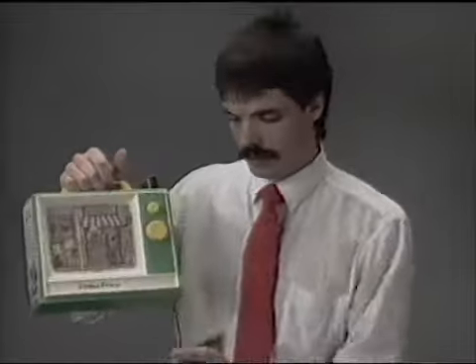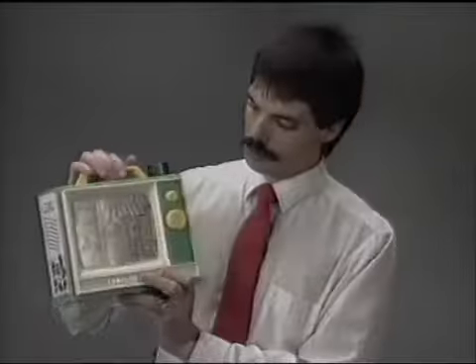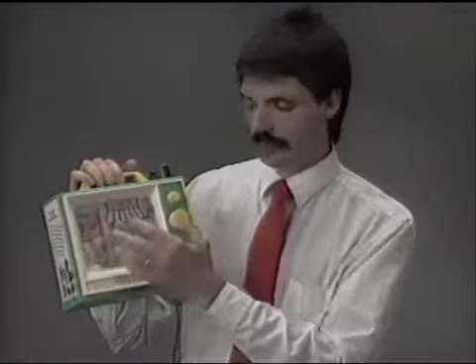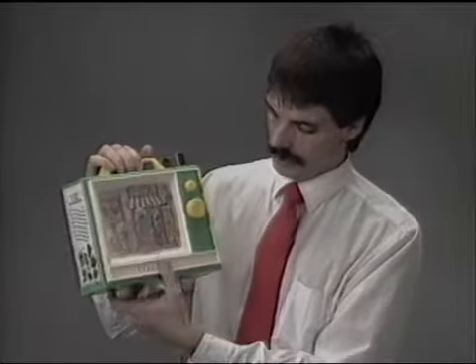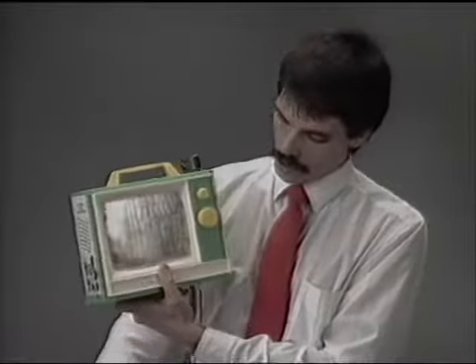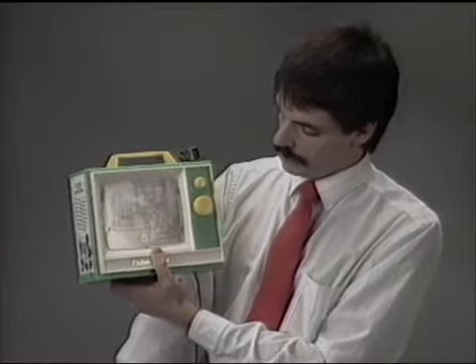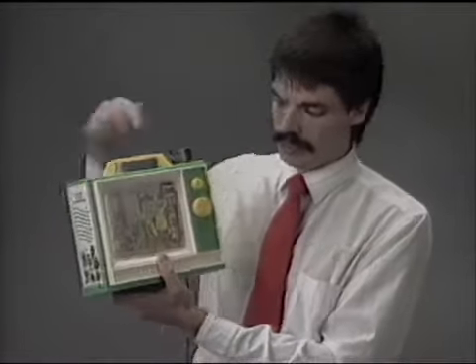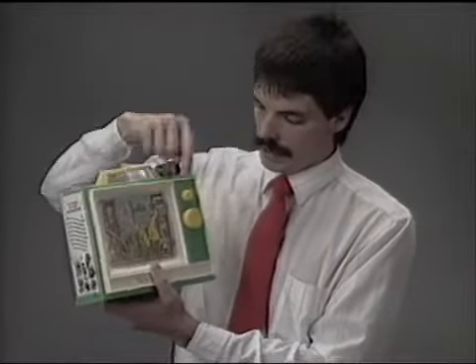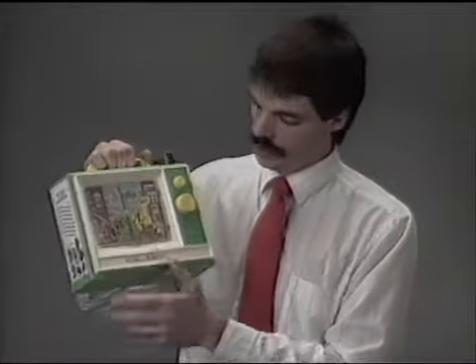Basically, this roll goes around and around, and some very bright speech therapists said, you know, if you can cut a hole in the back of this, I can paste on pictures of mom and dad and shapes of apples and oranges and squares and all those types of things, and we can put a big arrow down here. And imagine my thumb as the arrow. When I go around, if I, for example, say stop the device when Big Bird appears, and it could be a ball or whatever, now we have what's called a linear scan or linear tracking, and now we can signify that we may want a ball or to talk to mom or dad or want to look at the picture of Big Bird. So we can do all that using a very inexpensive device.